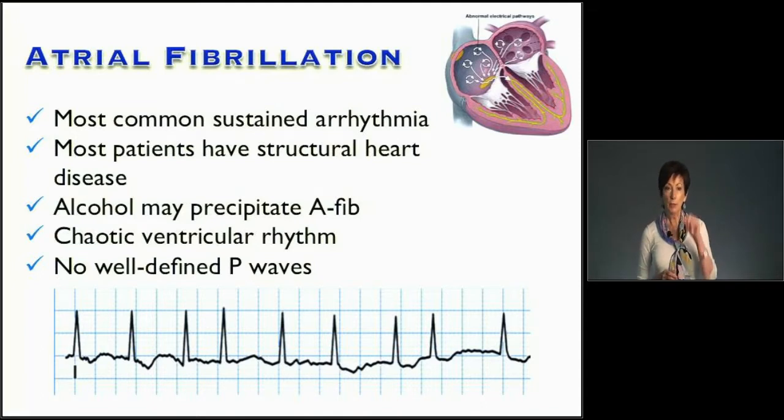A medium would be where you can see the fibrillatory waves. Fine would be almost like a straight line. And then coarse, sometimes somebody might say, well, that looks like a fib flutter. Well, your heart can't fib and flutter at the same time. And remember, fibrillation and flutter are distinguishable by atrial rate.